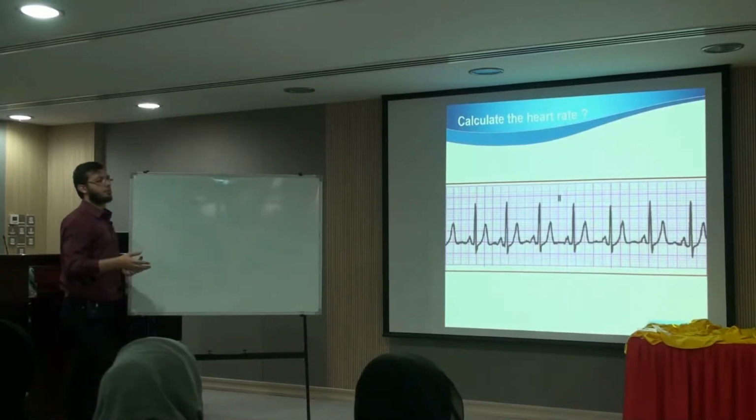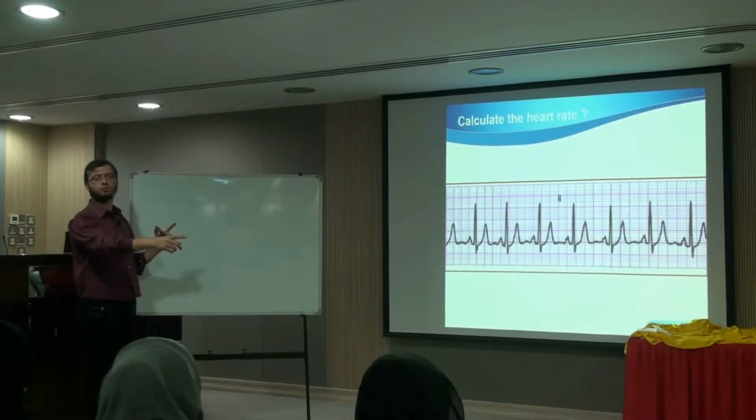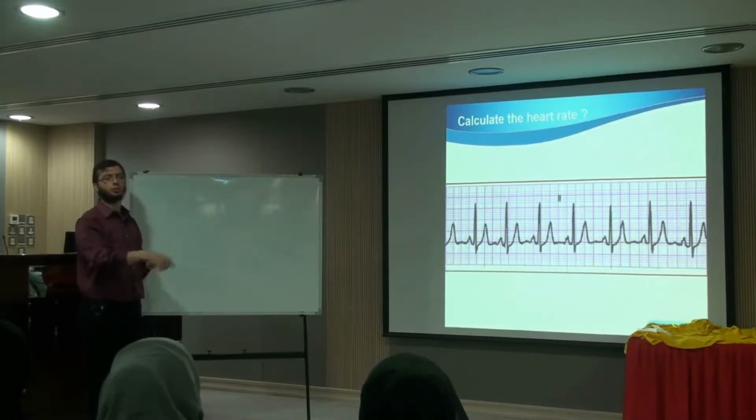In other places, like in Germany, they will not display the 12 lead ECG with only lead 2. They will display it with V1, V2. And in some centers, like in Egypt, where we have the EPS, the 12 lead ECG will include lead 2, V1, and V6 also.